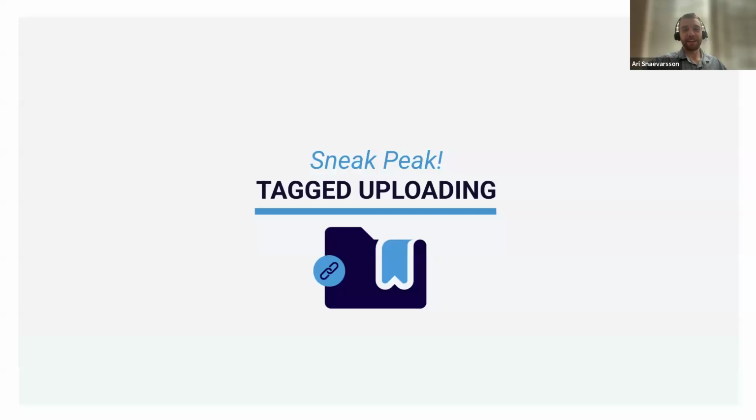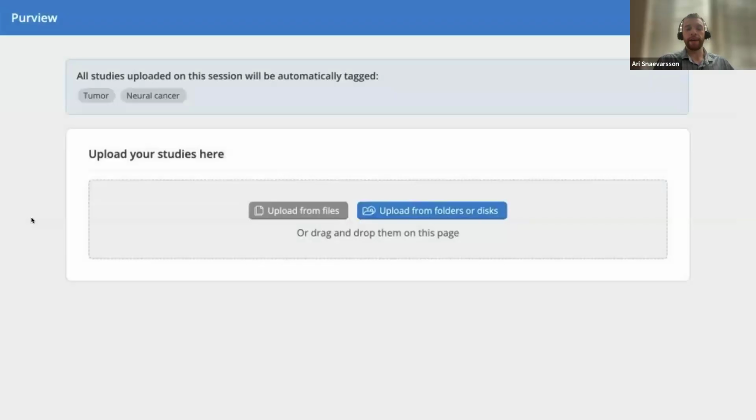So I'll move out of this and we'll take a look at what that looks like. I think one of those smart people that brought that up is actually with us today, so thank you. It's always client feedback that we got. And so this is what we call tagged uploading. Like Les said, this is a way to apply some of that tagging on the way in. You're getting a disk, there's maybe many studies on that disk that are all associated to one case. So as you see on the screenshot here, this is just a look at the uploader, and up top it says all studies uploaded in this session will be automatically tagged.